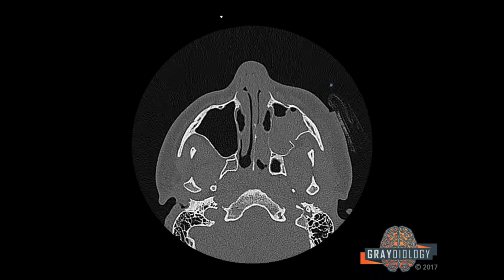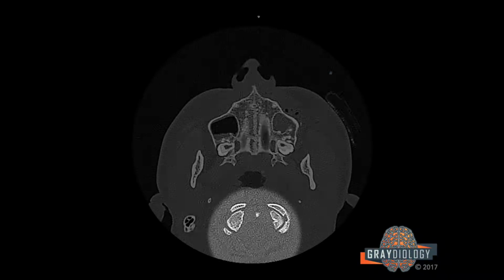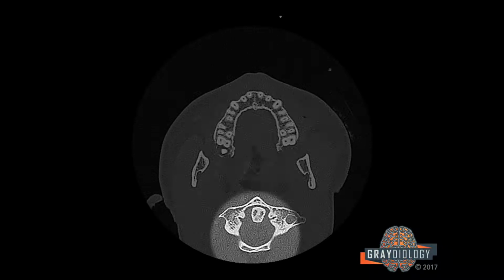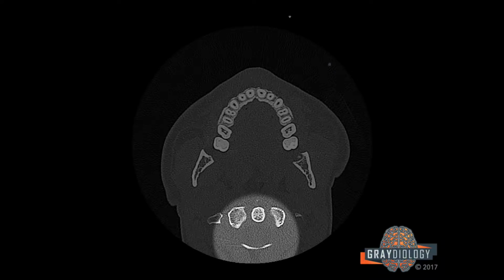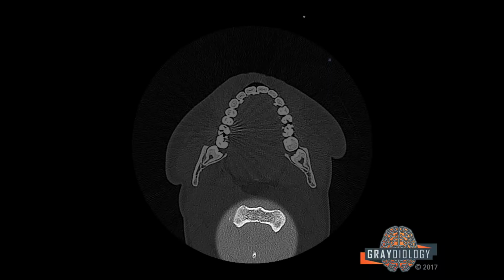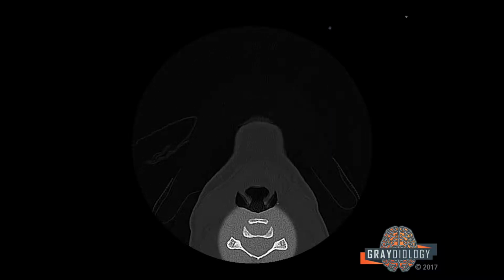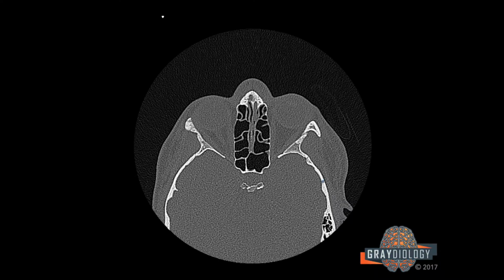If I have it, I will look at as much of the occipital bone as I can see, down to the foramen magnum, and of course, paying attention to the craniocervical junction. Anytime you have a fracture anywhere, it increases your risk of fracture everywhere. So people with facial fractures often have cervical fractures. And I'm looking down through the spine. And then I'm pretty much done.